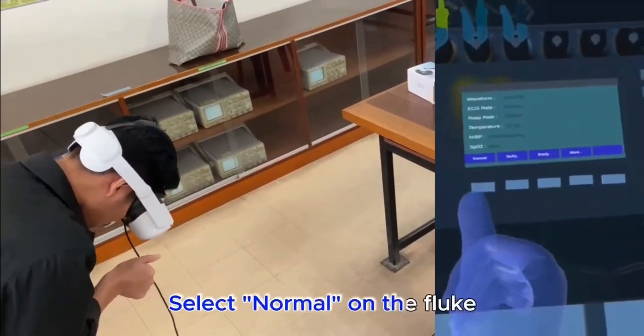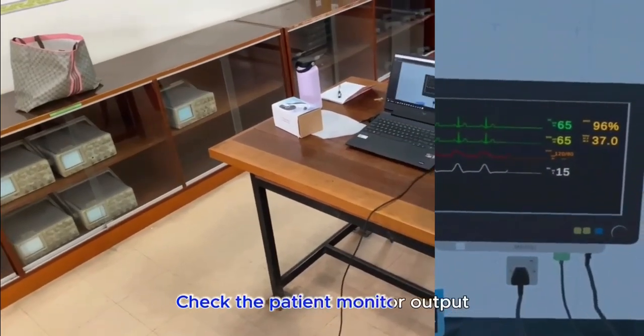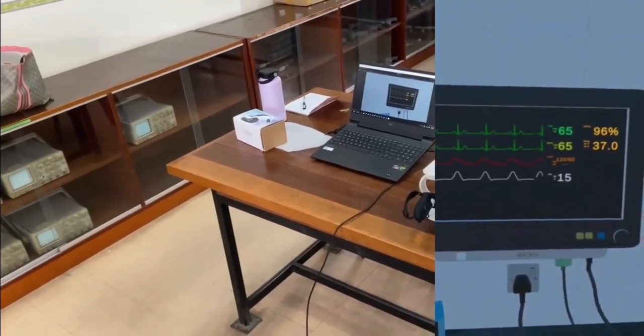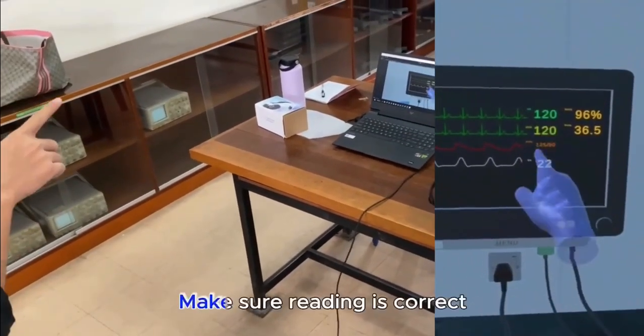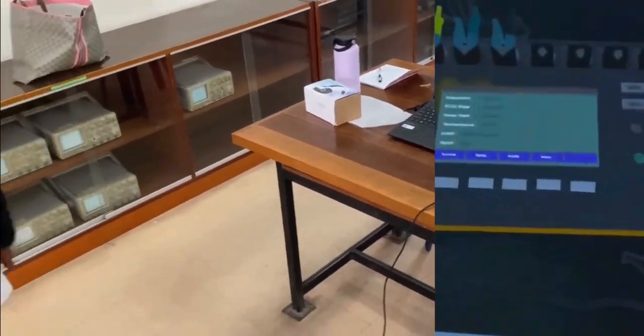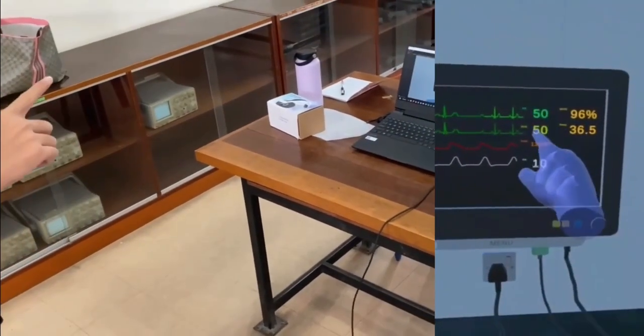After the user has connected all the cables, the user can choose the normal reading first and see the output waveform and reading value. After that, the user can also choose readings for abnormal heart rates like tachycardia, bradycardia, and the last one is asystole. After all is done, the timer will stop.